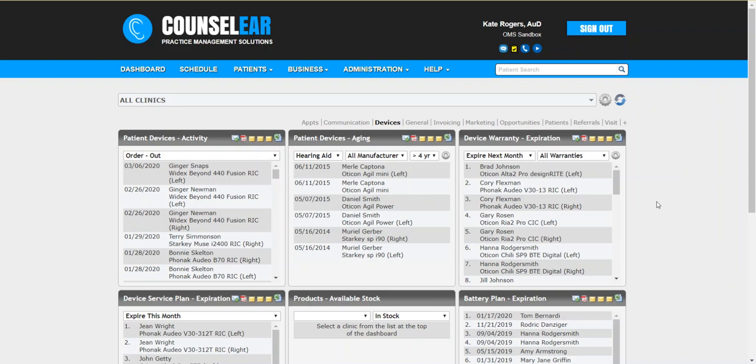Hello, and welcome to the CounselEAR Complete OMS tutorial on the CounselEAR Telehealth system. We'll begin by showing the activation process within CounselEAR, and then show how you can utilize the telehealth system with your patients, with their caregivers, their children, as well as your staff.